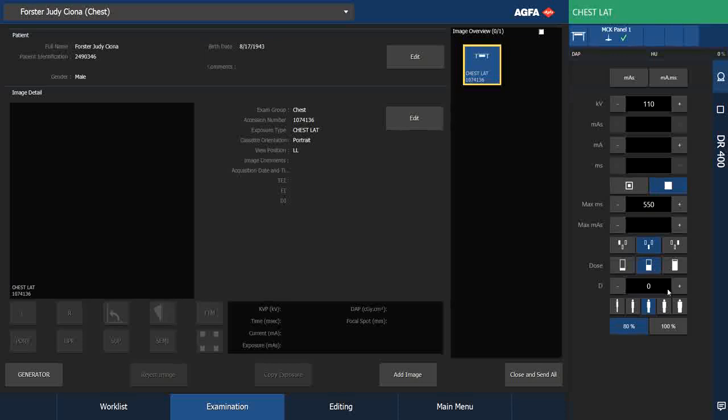So here you have a density step, a film optical density step, which follows the Renard scale. So this is again legacy film technology. But if you have a doctor who likes to see something a little bit darker, then you go up, and it translates into a 25% darker image following the Renard scale. So typically we set that to 0.